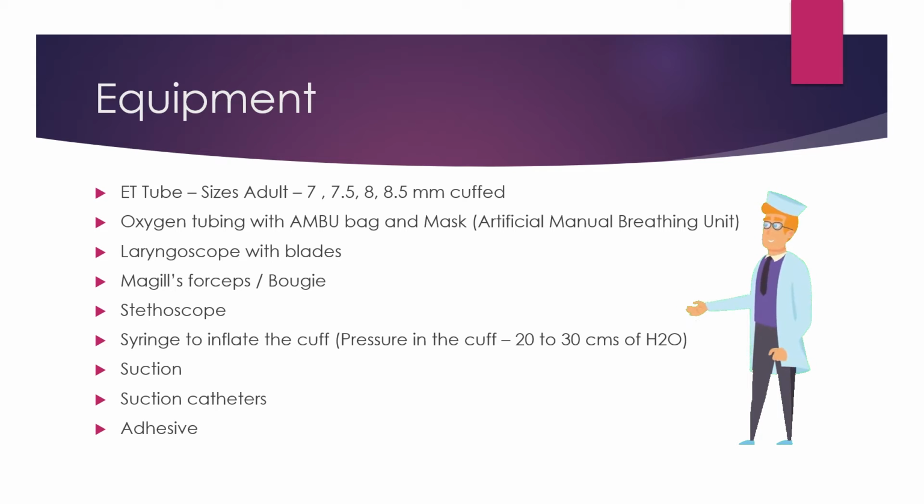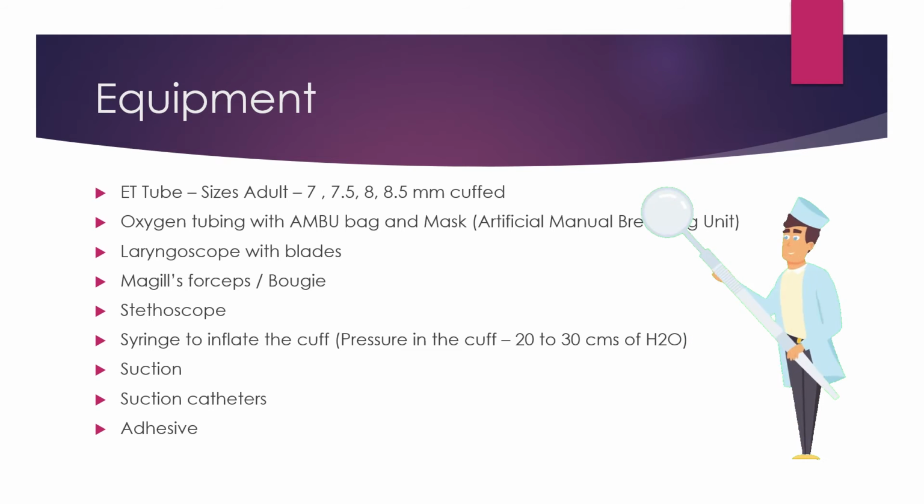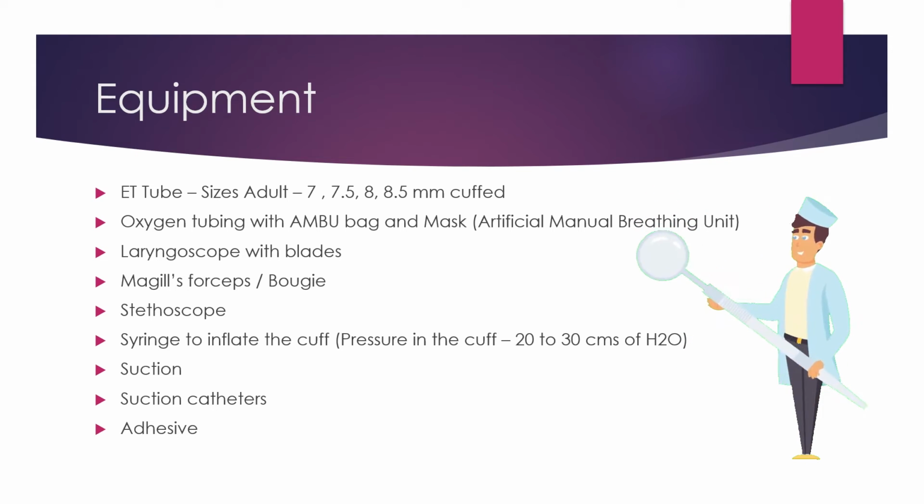And finally, the adhesive to secure the endotracheal tube in place. You can also have xylocaine spray or xylocaine jelly. That is so that we can help anesthetize the vocal cords or the oral cavity so that there is less trauma to the vocal cords.